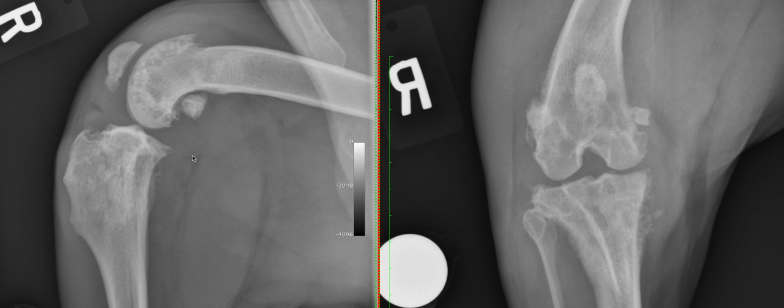Other differentials eventually for subchondral erosions like this would be to have septic arthritis or to have an erosive immune-mediated polyarthritis, for example. But that would probably be less likely in that case because we had only that joint affected. So that's it for this case.